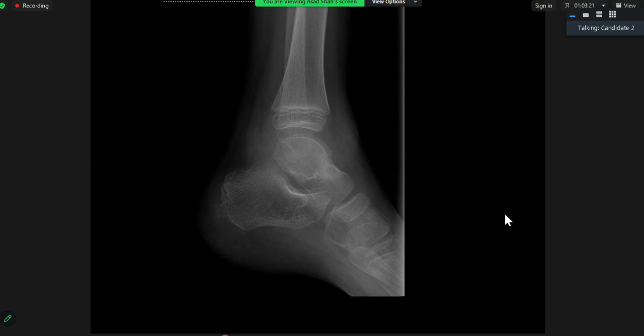In the visualized tibia and the fibula, there is no gross abnormality. This area of increased haziness involving the soft tissue surrounding the ankle joint. Increased haziness. Yeah, okay, fair enough. The soft tissue haziness. Yes, all right, good. That's good. So always look at the soft tissues.